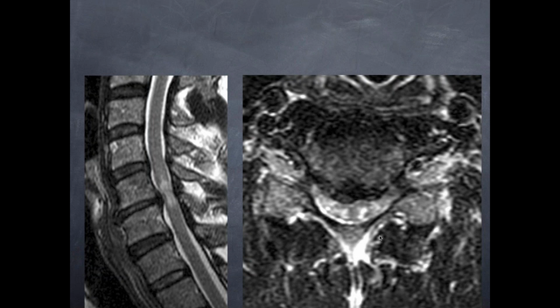Yeah. And if you look on the axial images, it looks like you have kind of owl's eyes here. See the two little things there? When you see that, there is some evidence, I'm not sure really how strong it is, but generally a lot of people believe that when you see edema on two sides like this, that's highly associated with ischemia of the cord due to the compression.